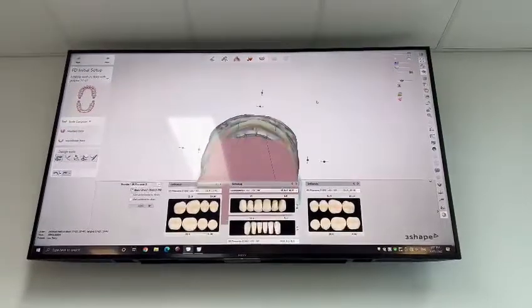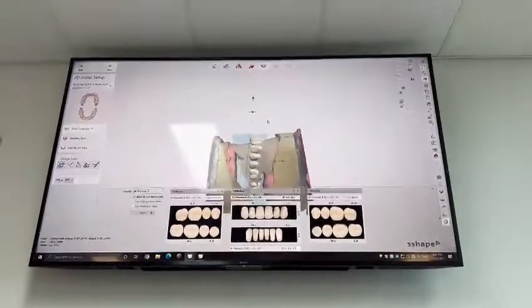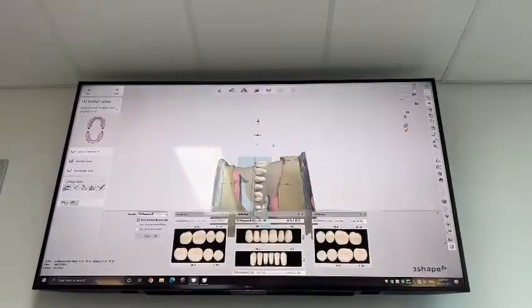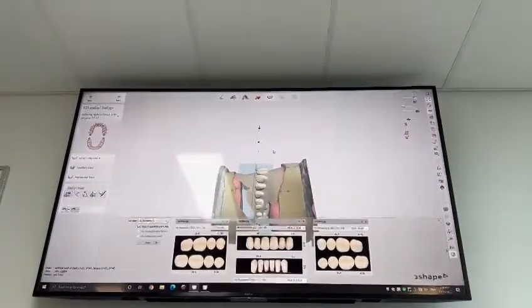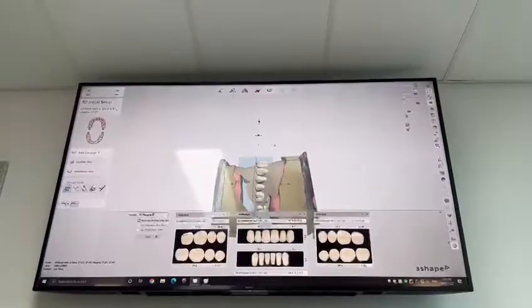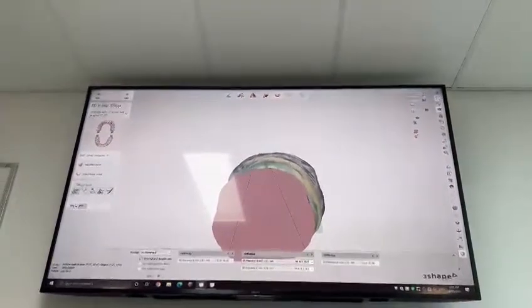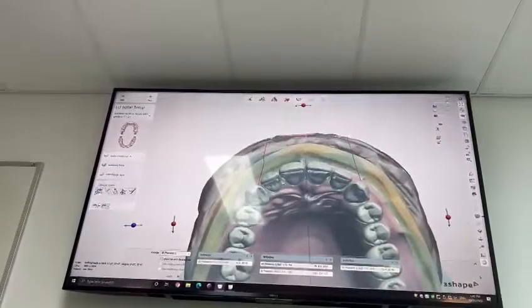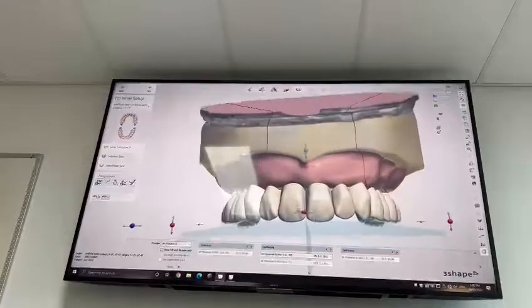Then what I'll do is we'll put the upper anterior teeth on and turn our bite block on. For this case, this bite block is way far in, so bring it further out. If we were doing this to a real case, they'd have a bite block with the contour there nicely, exactly where they want it. But this simulation case isn't really correct. So we're going to have it a bit forward, and I'm looking at where this is in relation to this ridge here. So I might move this around a bit like that.